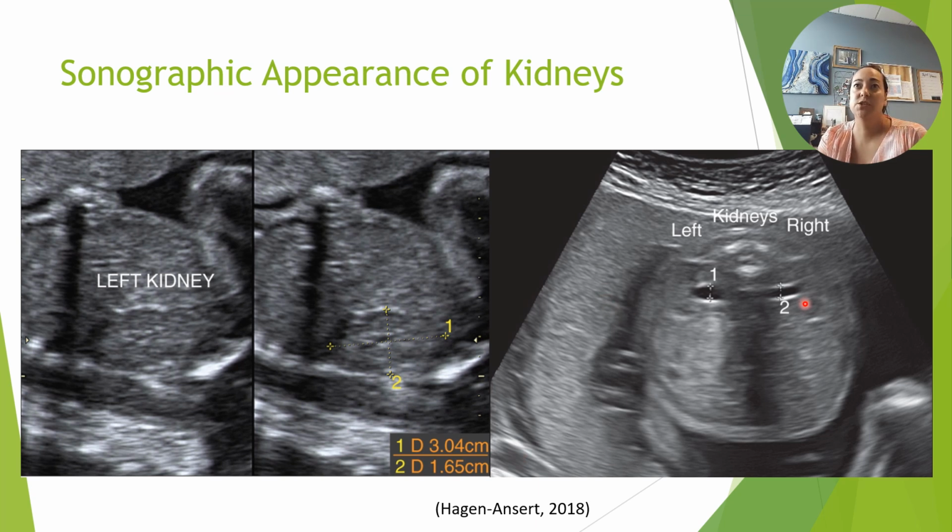And then looking in the transverse view, we can see a kidney on the left side here, and then a kidney over here, and they actually measured these renal pelvises. I don't have a measurement associated with this image, but I would wager that that is normal. So sometimes you can see those renal pelvises and they look a little bit prominent, but it can be a normal amount of fluid. So you always want to throw a caliper on there. And you can put calipers on these in a normal patient to prove that it's normal. You don't need to put any numbers on the report, but you might want to just give the interpreting physician information to determine if it is normal or not.